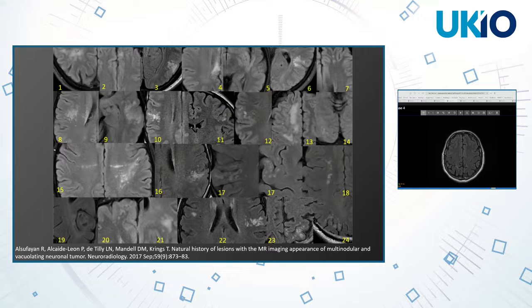So the strategy for these patients is essentially to suggest it so that it's not taken forward in terms of biopsying and so on. That's unlikely to be the cause of whatever the patient's symptoms might be. And at most, you might want to follow these up. So the case that we saw hadn't changed in about 3 years. You could do some follow-up imaging over time just to make sure that they're stable, but probably after 1 or 2, you won't need to image any further.